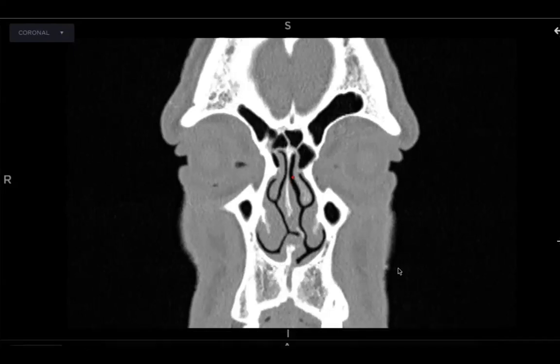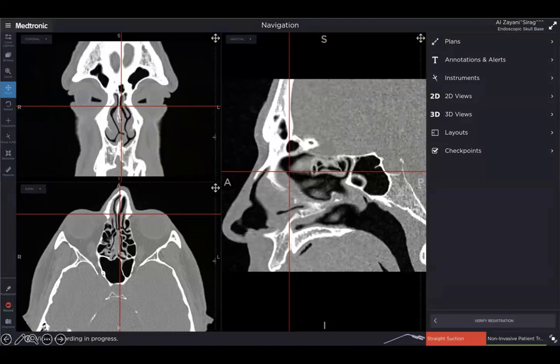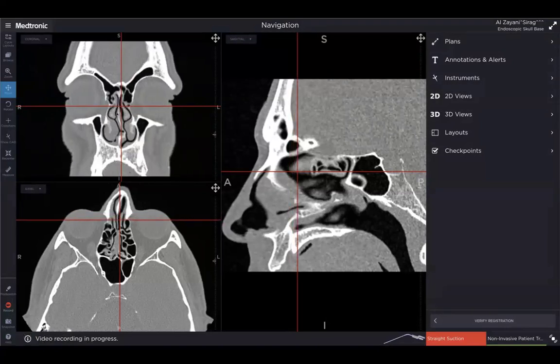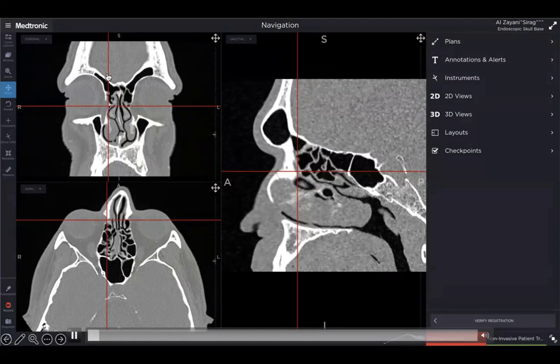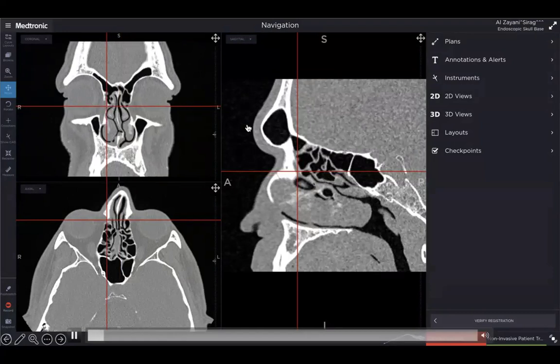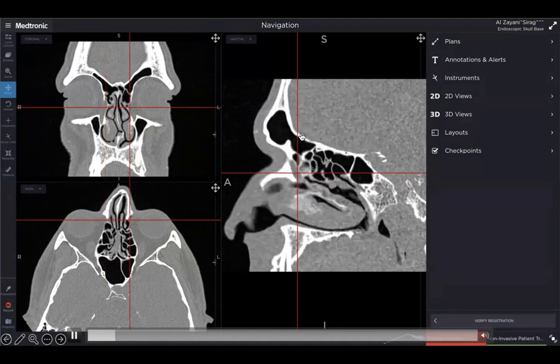So if you look at this carefully on a 3D scan, right? So again, this is the same patient. Now we're going through it on an orthogonal 3 planes, looking at the same time. So first, just the coronal that you've already seen. If you take your marker and cut it right through the lacrimal duct on the right side, you see the frontal recess on the right side. And you see a couple of things. You see that the skull base takes off anterior to the anterior buttress, and it's wide. The opening is wide.